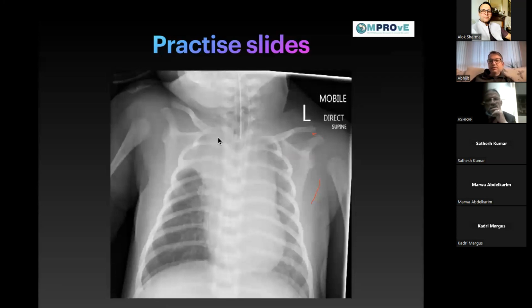I'm not saying that in this kind of situation you never see collapse. Most commonly you do see collapse. If you have a high riding tube, that's the area more prone to collapse, plain and simple collapse, no consolidation. But if you have a lung ultrasound, you can just run over it and see, oh, there's a thymus there giving you this picture.